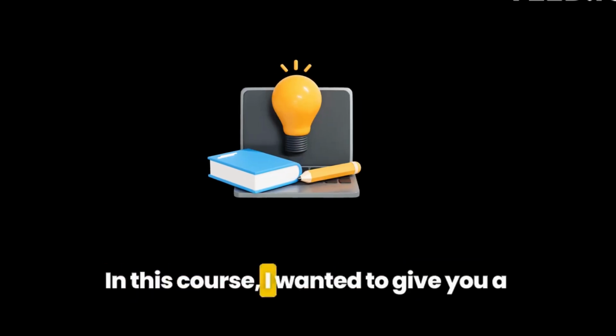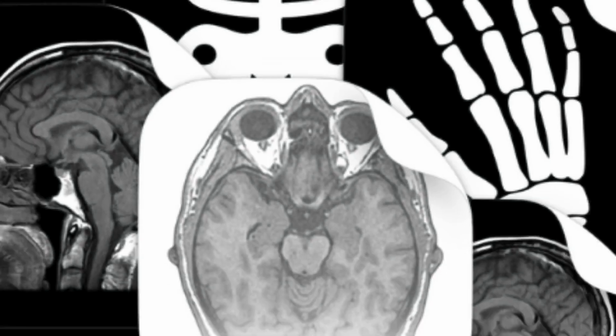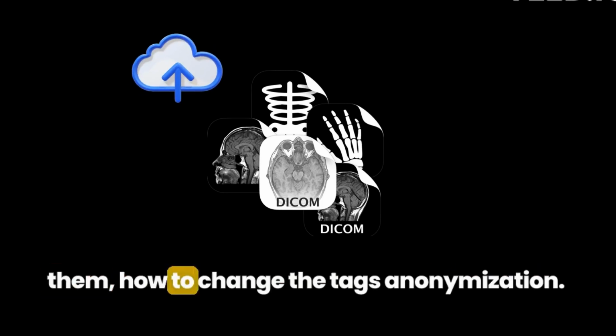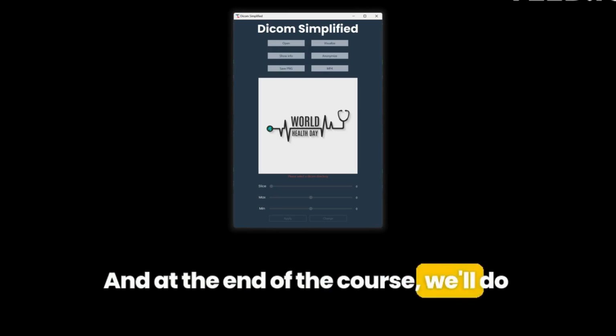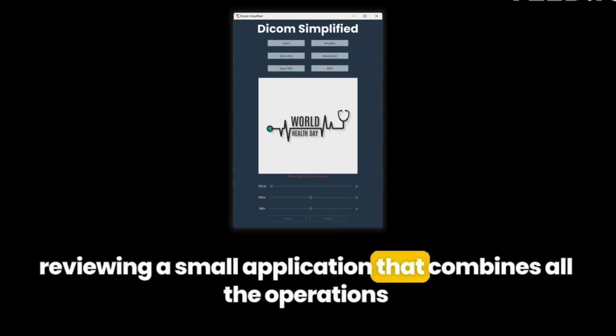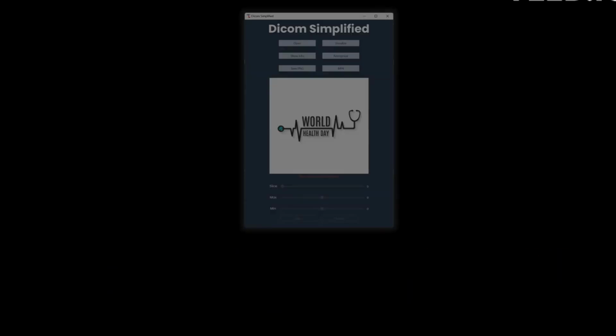In this course, I wanted to give you a quick introduction about how to work with DICOMs, like how to visualize them, how to upload them, how to change the tags, anonymization. And at the end of the course, we'll do a small project which will be building or just reviewing a small application that combines all the operations that we will see during the course.